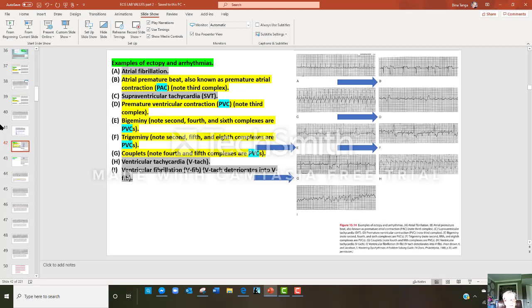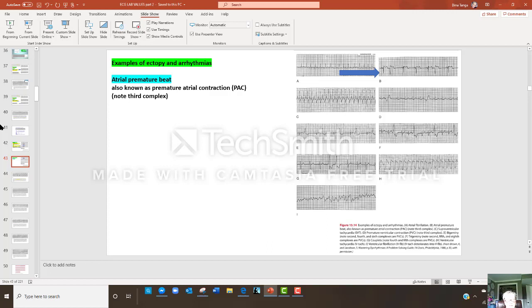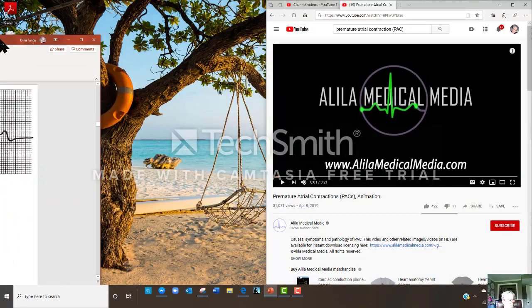examples of ectopy and arrhythmias. We're going to focus on PACs in this video and then move on to PVCs and be done with this particular study. So let's start with a PAC, known as a premature atrial contraction. So I already pulled up a pretty cool video.